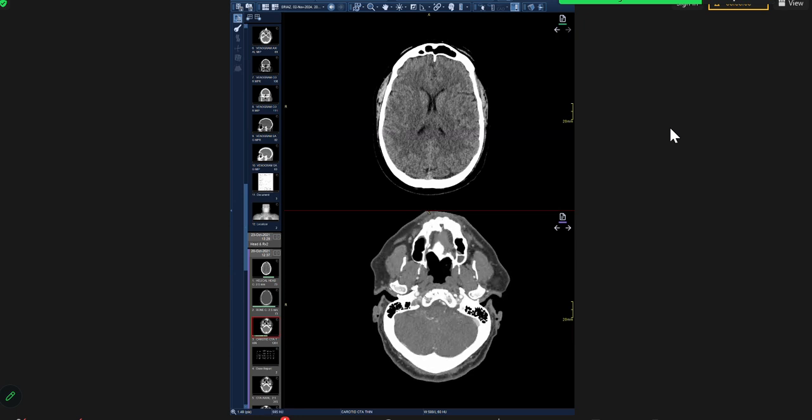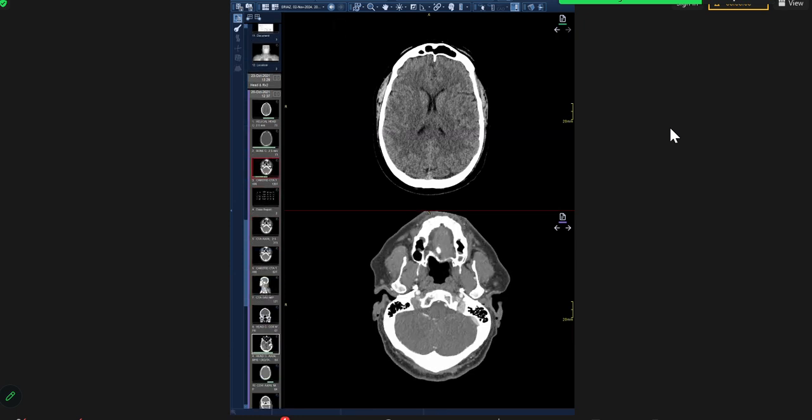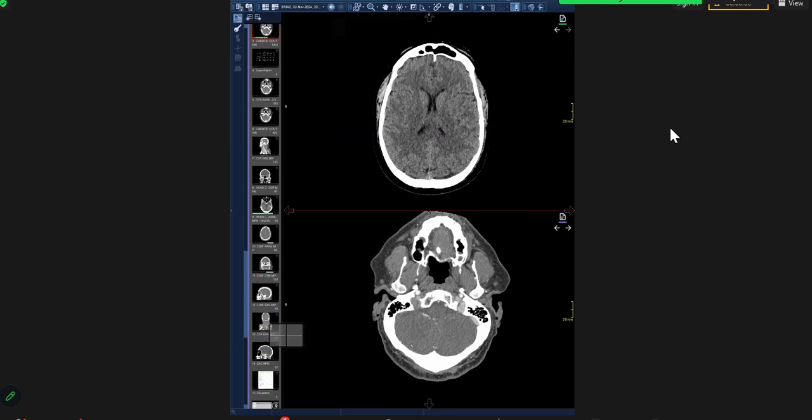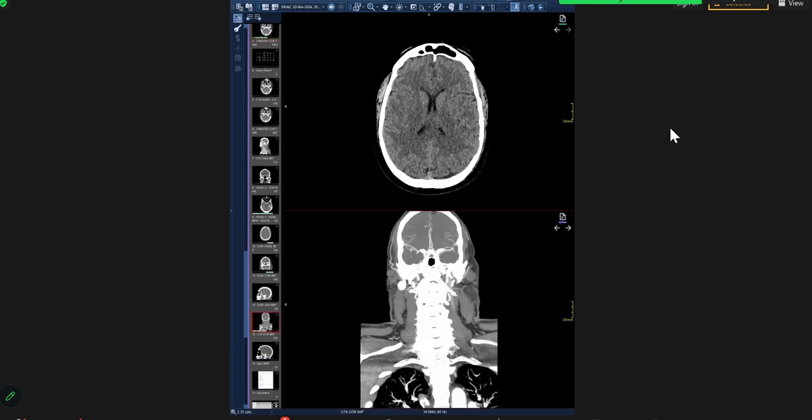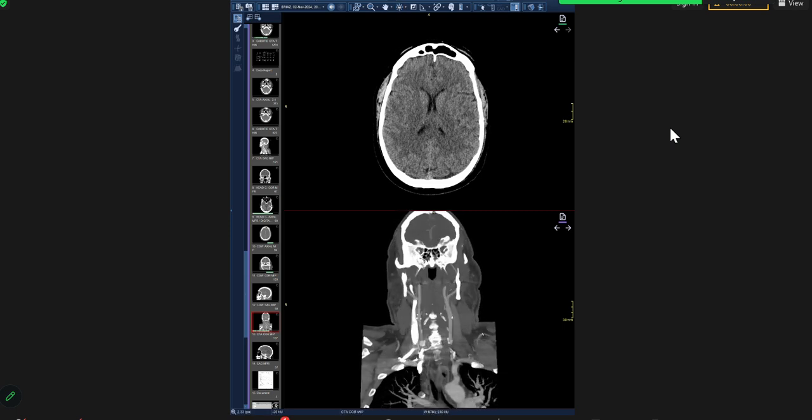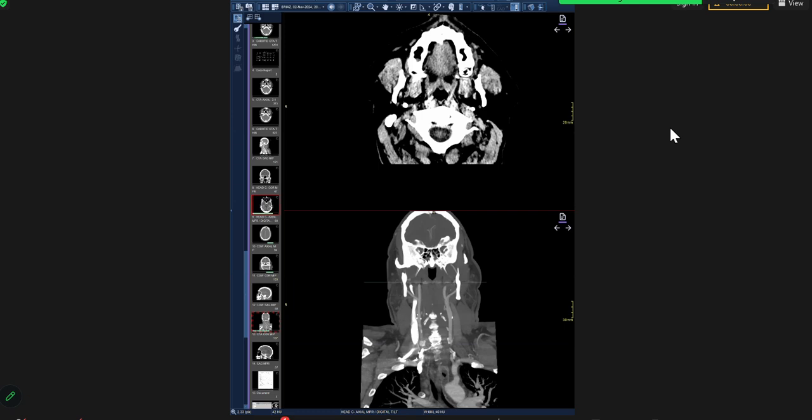So very, very important that you assume that you're going to be given a dural sinus thrombosis. You have to search for it. If you see bilateral thalamic low attenuation on a CT, always remember that it is very common to have internal cerebral vein thrombosis, and then the thalami would be swollen and edematous because of bilateral thalamic involvement. Okay, so that is also one very favorite exam scenario.